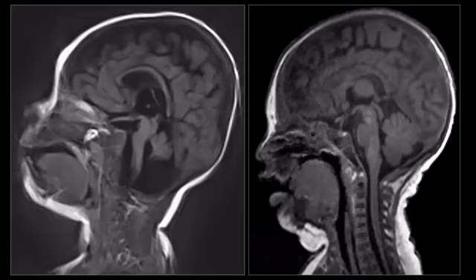It's a ciliopathy. And then we have another disorder, also a genetic disorder, can be caused by various kinds of mutations. We see the child on the left, we see a child on the right. The child on the right is a normal child, and the child on the left, we see atrophy of both the pons and the cerebellum if we compare it to the normal child.